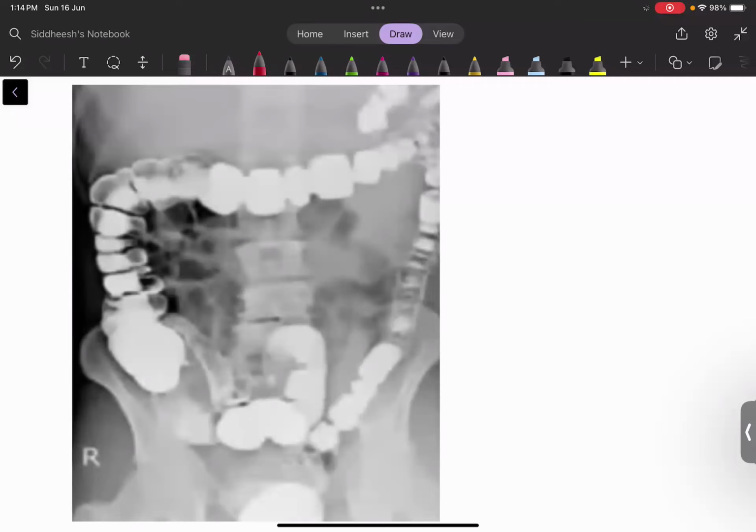No? Okay. The next image on the screen is again an X-ray. We are looking at the X-ray again, but we are giving a contrast. We are giving the barium again. What we are discussing today is all about the barium part, because this is what we can do with X-ray and abdomen scans. CT and MRI are the higher modalities that we will cover in the next class. Now, you can appreciate that we have some incomplete folds, like the folds are not complete, right?